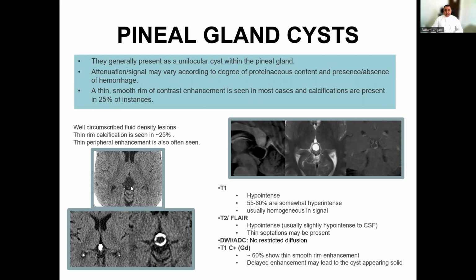On imaging, it has slightly higher density than the CSF because of its proteinaceous contents. It frequently demonstrates a peripheral pattern of linear calcification, and may contain chunky calcification within its inferior aspect. On MRI, it usually shows a cyst with a fluid content that almost matches CSF. After contrast administration it may demonstrate peripheral enhancement of its wall, usually thin, which may be complete or interrupted.